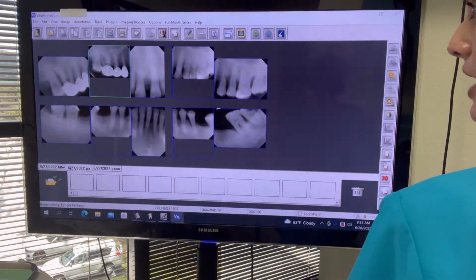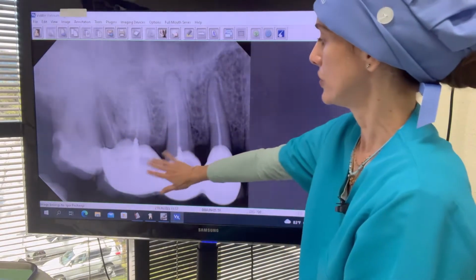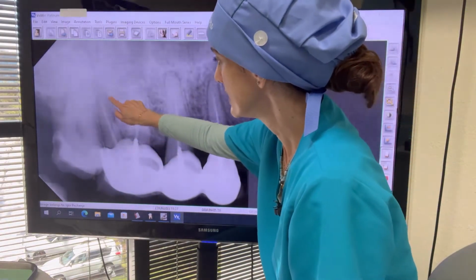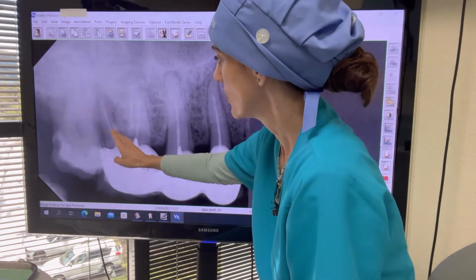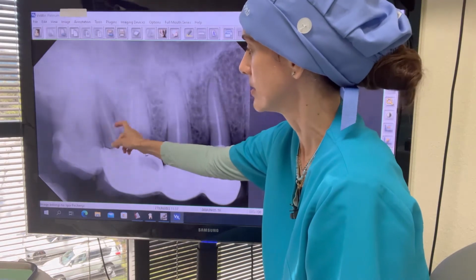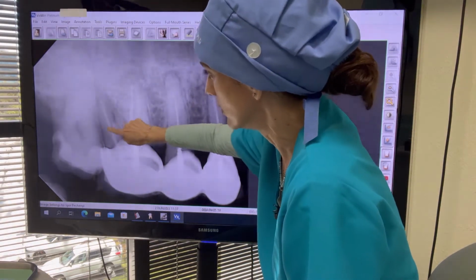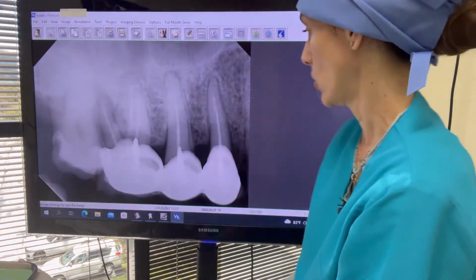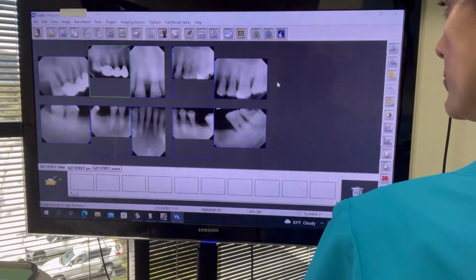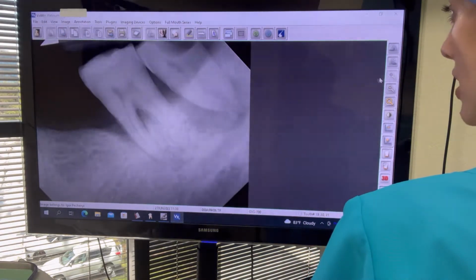to another, better view of that tooth that's under those three crowns joined together. Look at all the decay that ate away that root. That root is all decayed, it's rotten, and it's removing the bone that supports it. Okay, so we are going to proceed to the one on the bottom left that we were talking about.